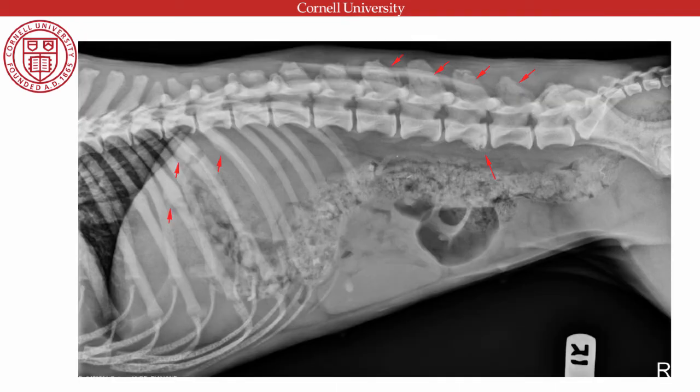Abdomen, more fractures of spinous processes. There's a chip here, another fracture here, another fracture here, another fracture here. She has a fractured vertebra at this level. It's sort of chipped off the bottom here. This is her end plate. You can see this little defect, and it's sort of displaced. These are her rib fractures here.